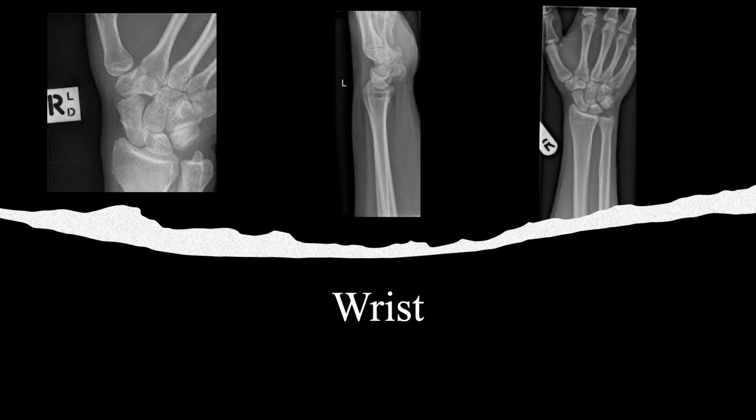The lateral view, you want to ensure the palmar tilt of the radius is between 2 and 20 degrees. So right here, you have the radius. You want to ensure the palmar tilt. I'm not going to do a great job with that angle here, but it's okay. But it is between 2 and 20 degrees. Right there. You want to ensure that the dorsal surface of the radius is smooth. Here, nice and smooth. You want to make sure that the articular surface is smooth. Again, right in here, what articulates with the rest of the wrist.